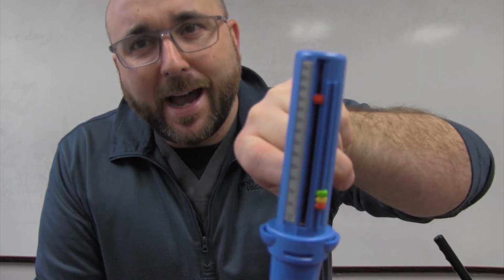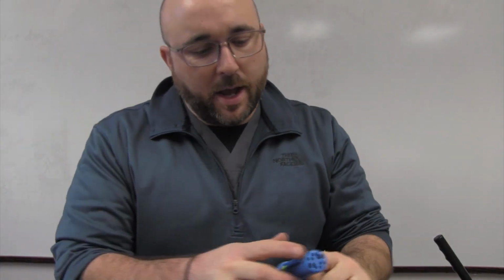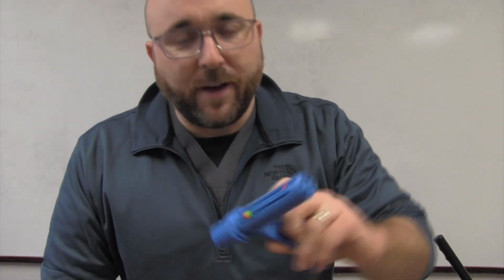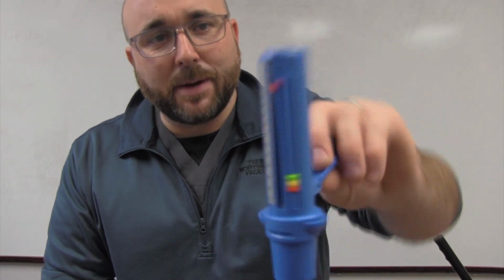So when I blow, you can see, if this bad boy will focus on it, I'm about 550. So 550 is where I am there. I can pull it back and do it again. I get about 650 that time. I don't have asthma, and not any exacerbation right now. Do another one. As fast as I can, open mouth, and that's about 600. Let's say 600 is where I am on a normal day. Well, that's really good to know, and that's how we set these things.